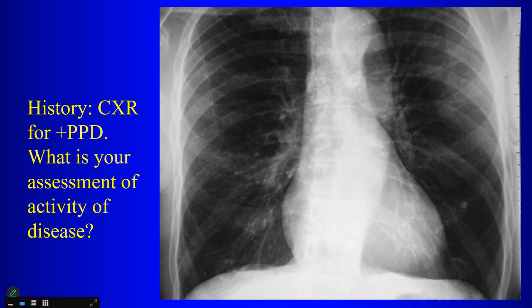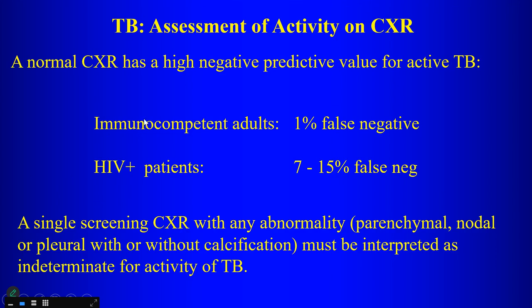What this question is getting at is if this is the only X-ray you have, and there is a finding there that can be related to tuberculosis, technically you can't put no radiographic evidence of active tuberculosis in your report, because it is possible that the patient might still have active disease. Unlikely, but it is still possible if this is the only X-ray that you have. This is the only film that you're looking at, okay? So what I like to say is, no consolidations, no cavitary lesions, calcified granuloma, consistent with history of exposure to tuberculosis. Chances are it's not active disease, right? But technically, if this is the only X-ray you have, you can't really say that.